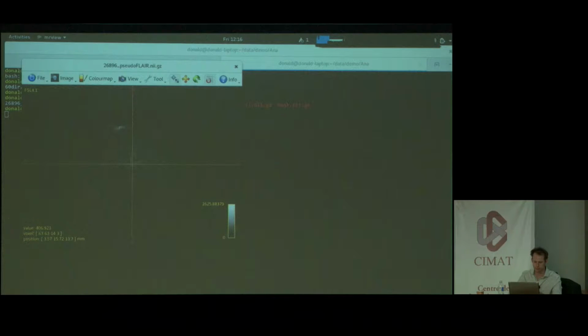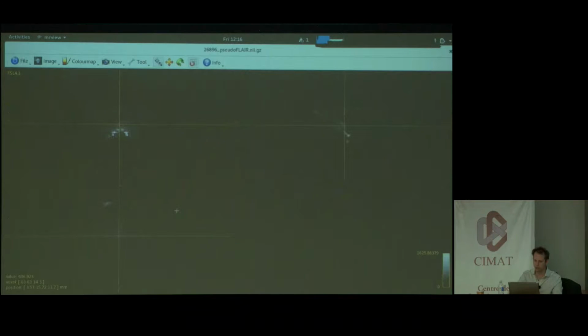So it's a reduced field of view, and there's a bit of eddy current going on. You can see there's a bit of eddy current motion in the data here by looking at the motion of the interface. That's not unexpected. It's a Philips system, I'm guessing, which uses a single pulse gradient spin echo rather than the twice refocused one.